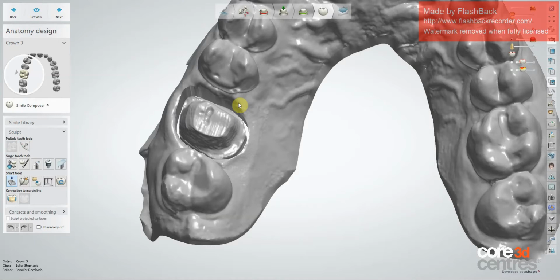Now, the majority of my world when it comes to designing revolves around using this setting right here, individual transformation, where I'm placing the tooth. I've probably trained 8, 9, 10 people in 3Shape, and I finally got to the point with one of my trainees where I said, you're not a designer, you're not creating a tooth like you're sitting down and waxing it on the bench with the wax carver and a blob of wax. You're literally placing a tooth that you've been given.